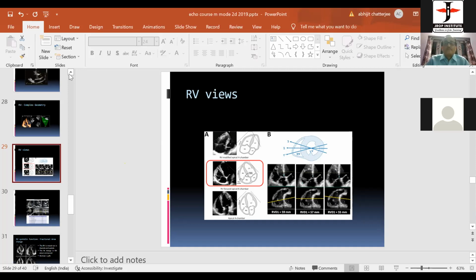Okay, sir. Thank you, sir. Thank you. Dr. Hiru, the mitral annulus should be measured both in 4-chamber as well as 2-chamber with the mitral valve opened up, like mid-diastole. Yeah, sir. Thank you, sir.